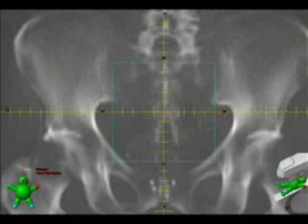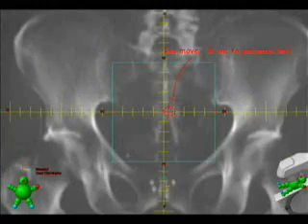If the doctor wants isocenter to be moved here, a half a centimeter to the patient's left, then all we have to do is move the table 0.5 centimeters. Let's see how this is done. On this phantom, superior is located up here and inferior is located down here. I have put a piece of masking tape where central axis currently is. This, over here, is the patient's left.